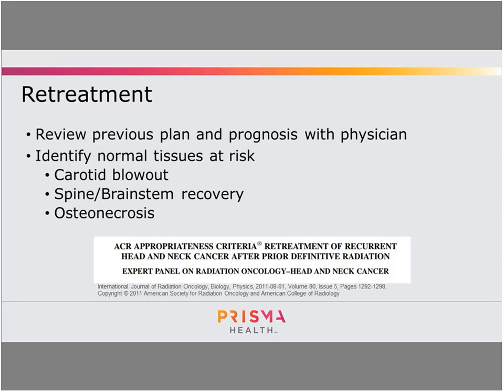So carotid blowout is a real thing. When you get around 90, 100 gray or higher, that can happen in about 2 to 4% of patients. That's just one of those risks that you want to make sure you review with the physician. And the spine and brainstem have normally already been taken pretty close to tolerance from an initial treatment, but these do recover.